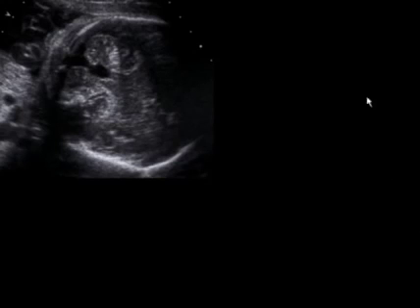Here's an example of a patient who was felt to have a Dandy-Walker variant. Here's the posterior fossa here and the cerebellar hemisphere here, and then the fourth ventricle, which appears to open posteriorly into the cisterna magna. But if you notice, the calvarium in this instance is incomplete. It stops right about here, and we don't pick it up till the other side. And that's our clue that this image was taken in a coronal fashion.